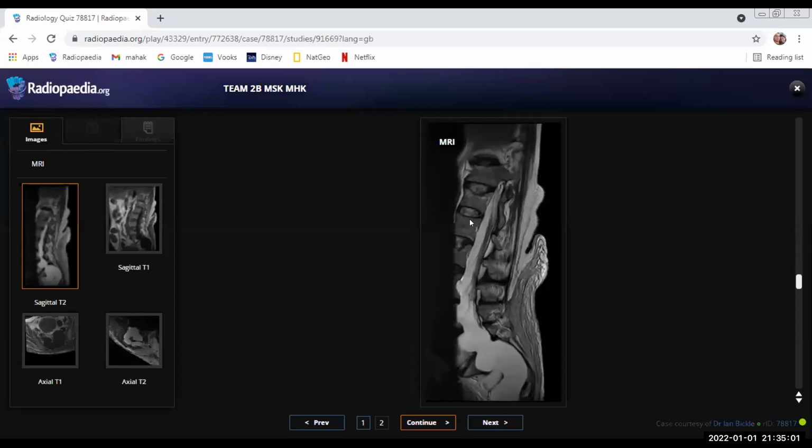I believe this is with the posterior vertebral body scalloping. Achondroplasia can be one differential. I can also see that there is decreased vertebral body height and superior end plate depressions. Dural ectasia itself is another differential. I do not see any neurofibromas. However, dural ectasia can be seen in neurofibromatosis as well. Maybe the neurofibromas are higher up in the thoracic or the dorsal spine.